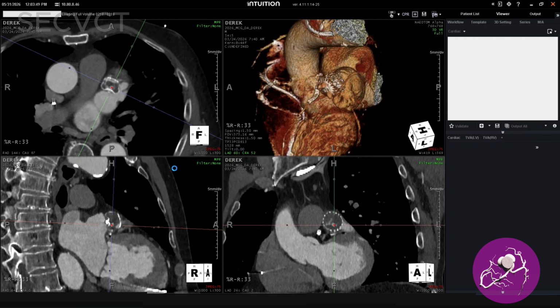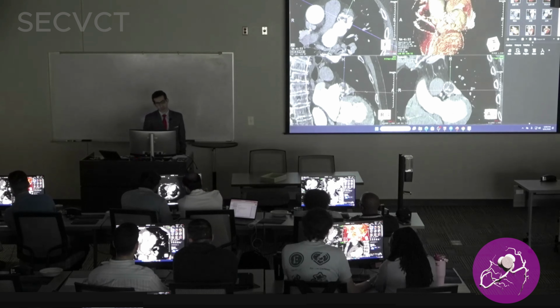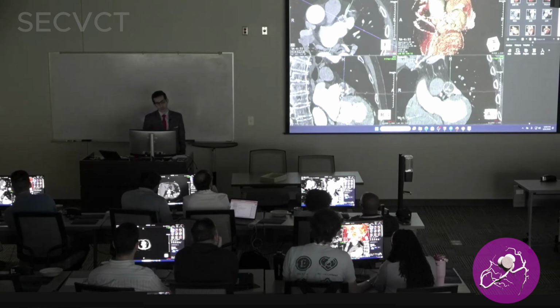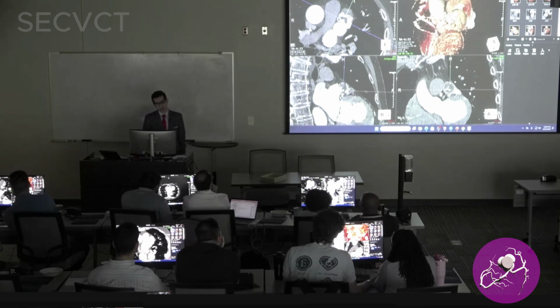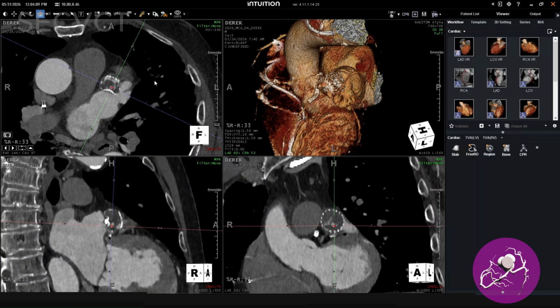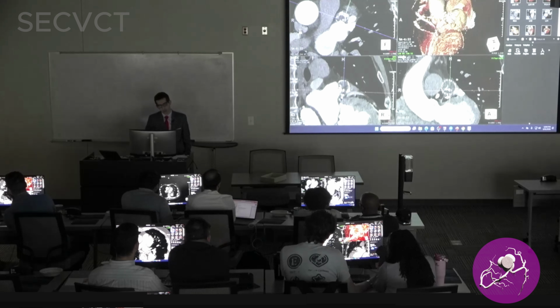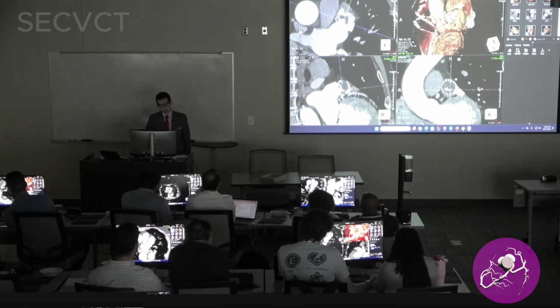All right, folks. So, going back to Dr. Rodriguez's lecture in the morning, is there contrast coming into the left atrial appendage? Yes. What is the mechanism? It could be, so that's three differentials, right? You mentioned the peri-device leak, incomplete endothelialization, or an uncovered lobe, right? I think this is the biggest lobe I've seen in the past 6 months.